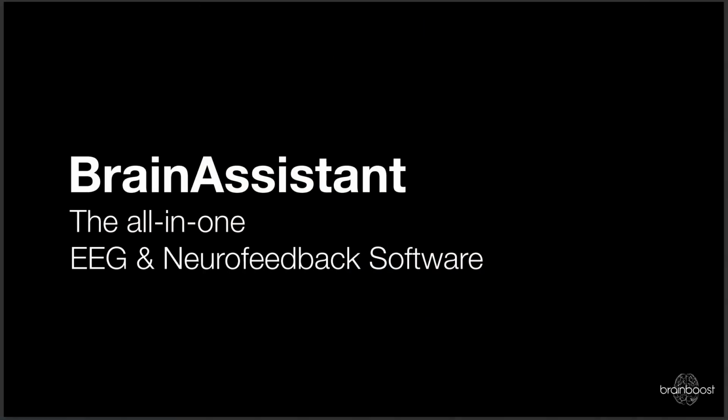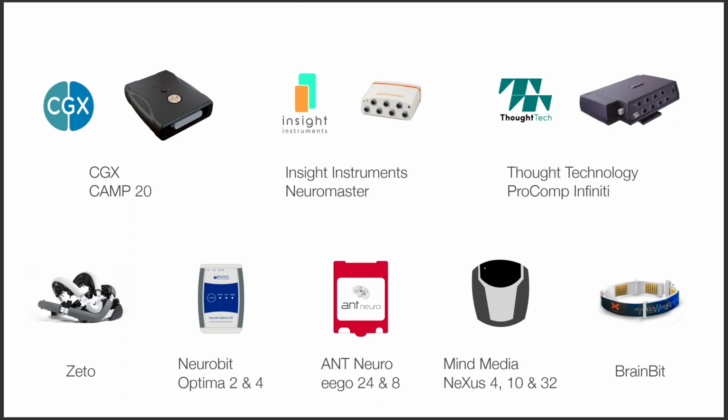I'm going to share my screen. You should see it now. And yeah, let's start. As I told you last time, there are more and more hardware partners we have that are connected with our BrainAssistant. I'm working on getting more and more hardware manufacturers to work together with us. Yeah, we're on it.